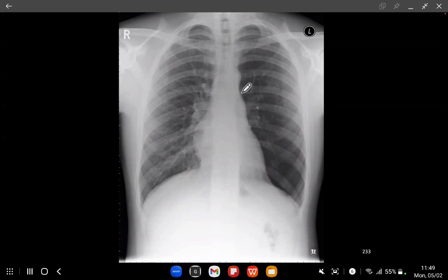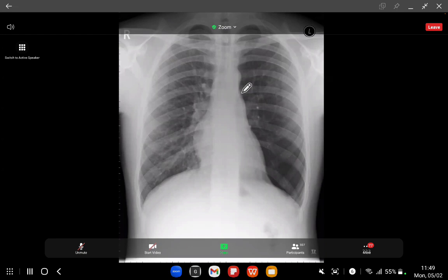Okay, hypertransradiant lung. How do we deal with it? Number one, we identify that it's hypertransradiant. The next thing we do is we count the number of vessels, and the number of vessels per unit area here are, for example, 30. I'm not going to count them, but just say they're 30. Well, on this side, they're probably about 15. So half the number of vessels, and therefore this is the abnormal side.